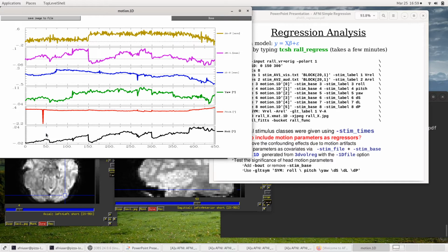Notice none of the other axes even really show that. That's because it wasn't quite the typical 3D rotation. We just literally did a 2-degree pitch. We had to fake that. The bad subject didn't move enough for a good class demonstration, so we added our own. But anyway, so these are the motion parameters.